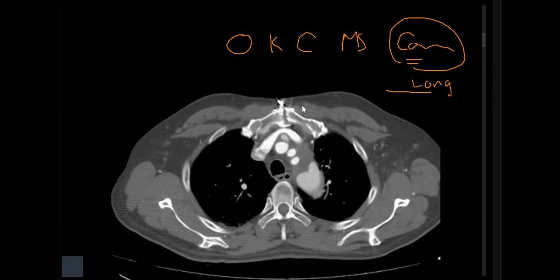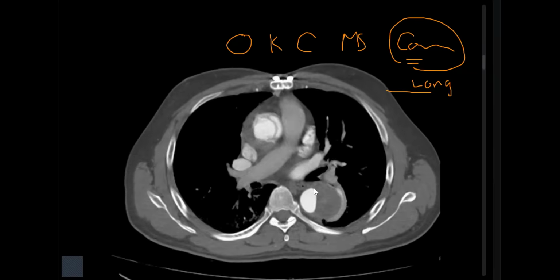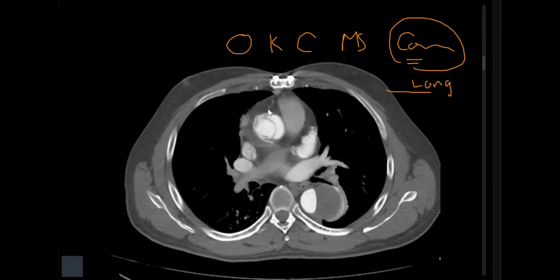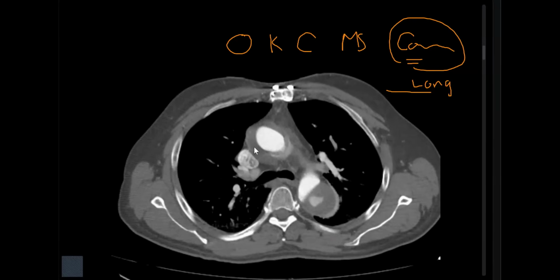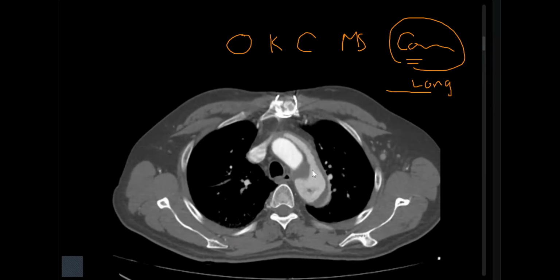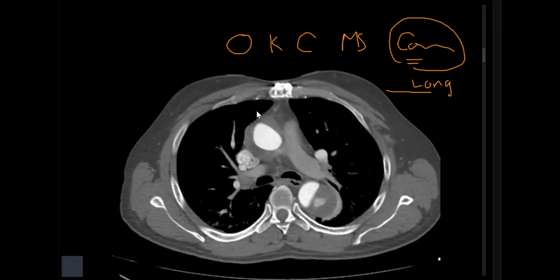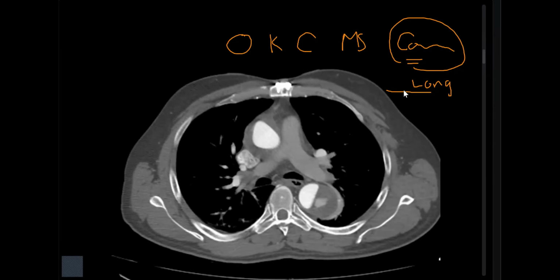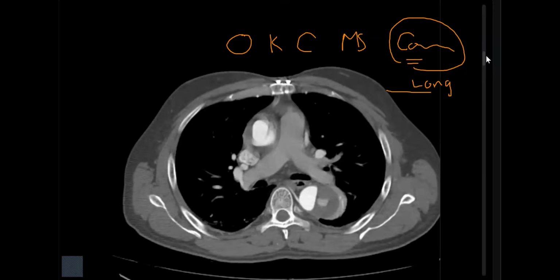As you started, okay, I'm presented with a CT with contrast. The main finding till now is the presence of an intimal flap. You said to me in the descending aorta. What about the ascending? Take a careful look. We have also here some intimal flap and mural thrombus. This is a thrombosis. The dissection may be a patent lumen, or a thrombosed lumen, like mural hematoma. So definitely, it started in the ascending aorta. Avoid long stops during assessment from the first cut till the last cut.